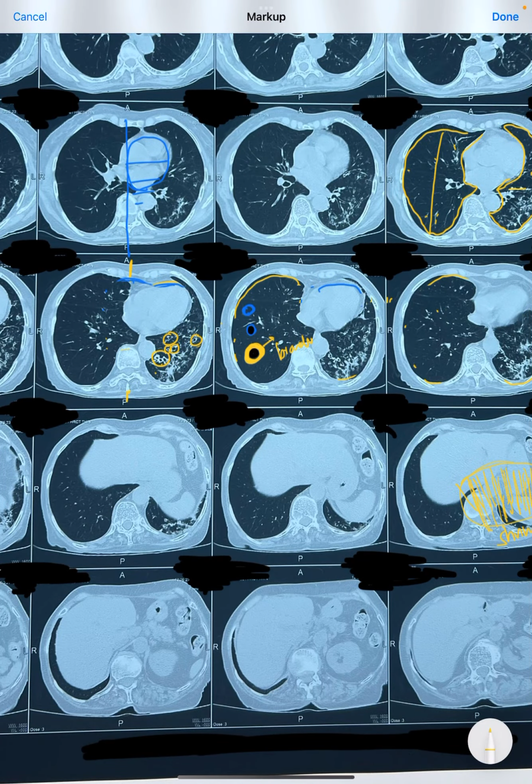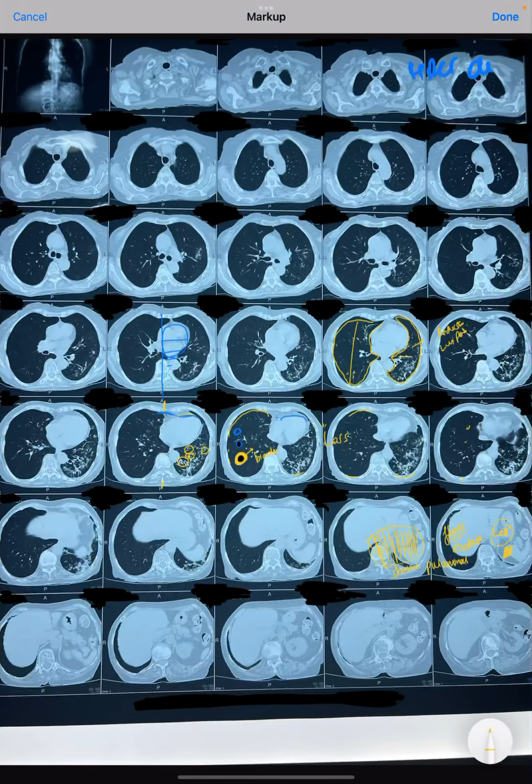So presence of so many fibrotic bands, loss of lung parenchyma, mediastinal shifting and bronchiectatic changes all tell us that the patient had a previous lung parenchymal insult which was significantly large, because we can see this lesion starting from here, 1 2 3 4 5 6 7 8 9 10.